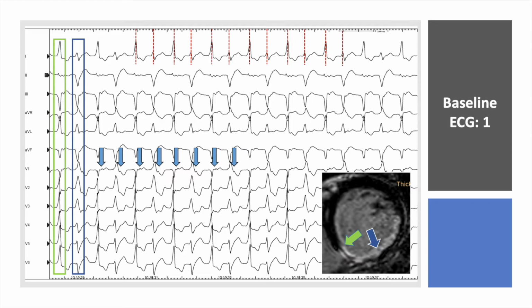In addition to different morphologies, actually in this case just two morphologies, we also have oscillating cycle length, short and longer intervals between each QRS complex. Therefore, this is an interesting example of a ventricular tachycardia with oscillating exits and most probably also oscillating circuits.